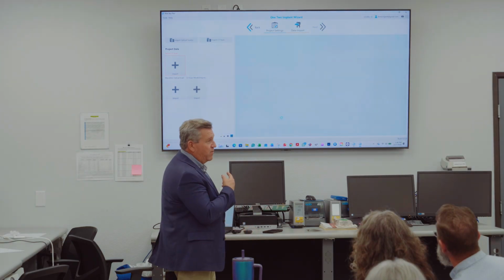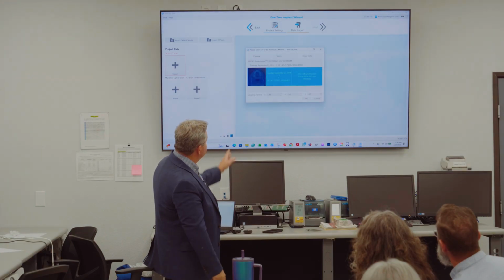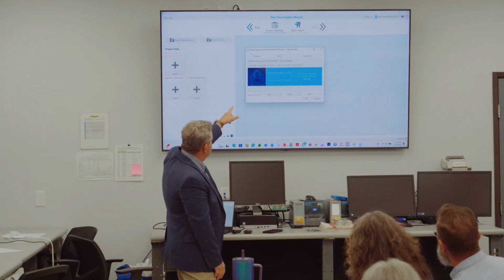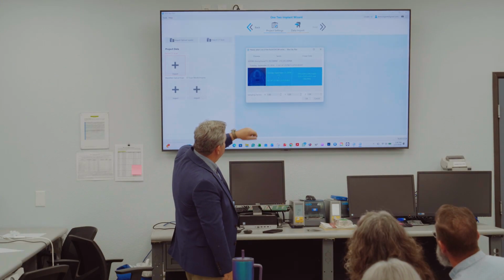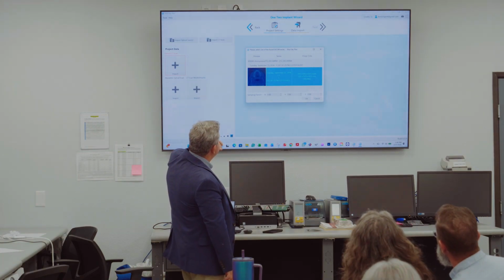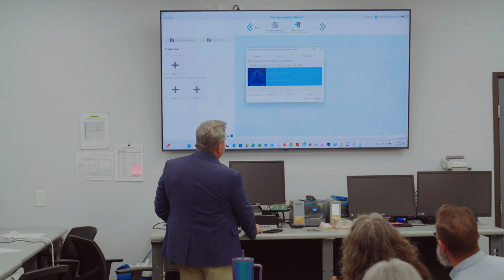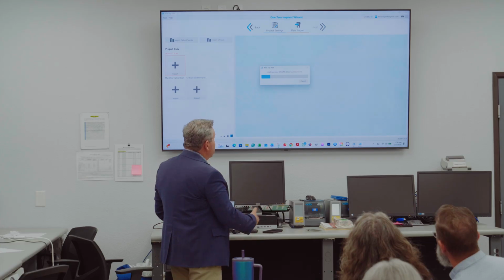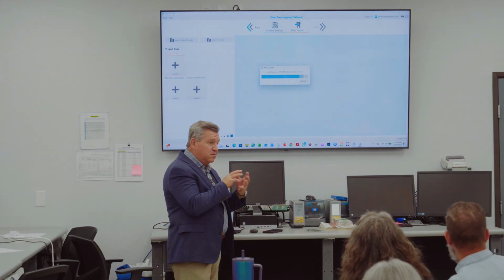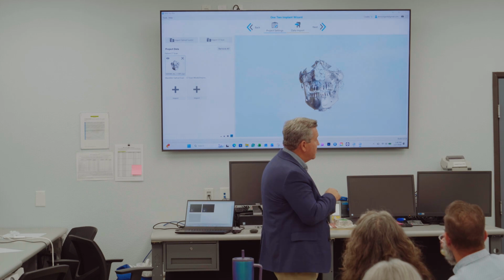Is everybody up to this point? It's going to start thinking about bringing in that file. So here we go. Gives you a preview, gives you the metadata about the case. Okay. And when you click OK, it'll let you preview it and make it smaller if you need to. So remember we talked about the smallest possible file size, okay?